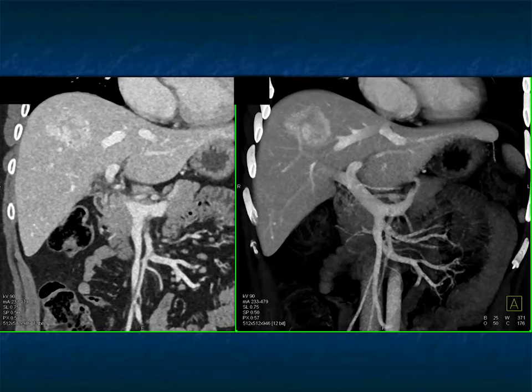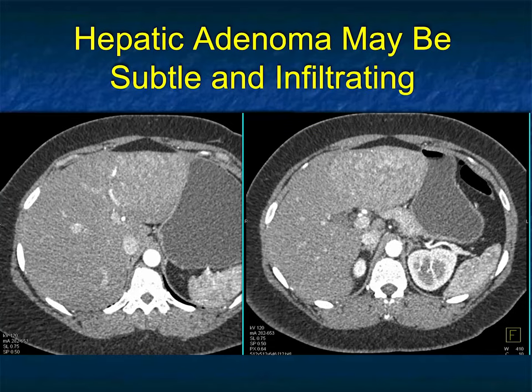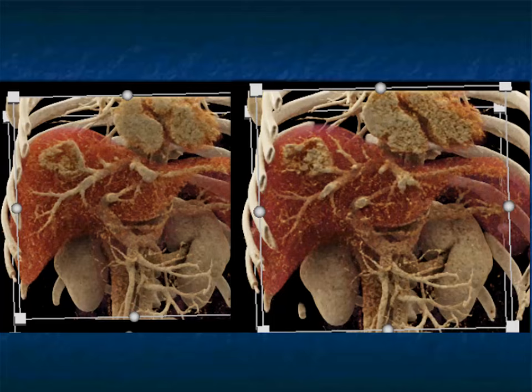And here you look at this on venous phase, image on your right, the volume rendered image showing you nicely the portal vein, which is widely patent. Here's the cinematic rendering showing you the mass. Again, that rim-like pattern, but I am concerned, and that lesion washes out, not like FNH, not like hemangioma. It could be hepatoma, but it was hepatic adenoma.